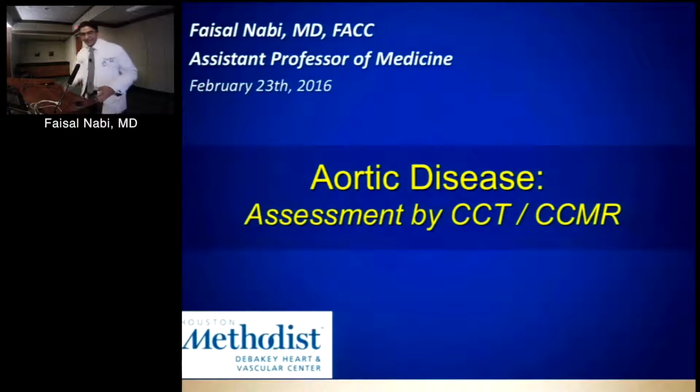Right? Okay, so thank you, Dr. Q. I will present the CT-CMR version of aortic disease. This is going to be a whirlwind tour of the aorta, some things that I have learned, going over mostly all the worst pathologies of aortic disease. It's going to be very CT heavy, and the only reason is CMR will really provide the same types of images. So I just chose one modality and kind of ran with it.